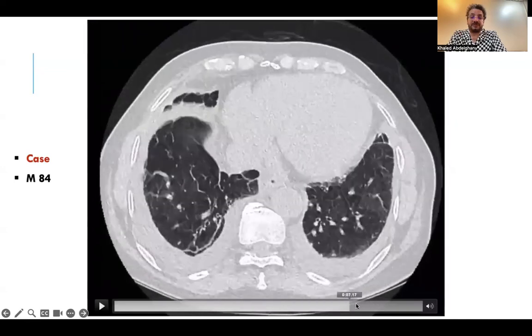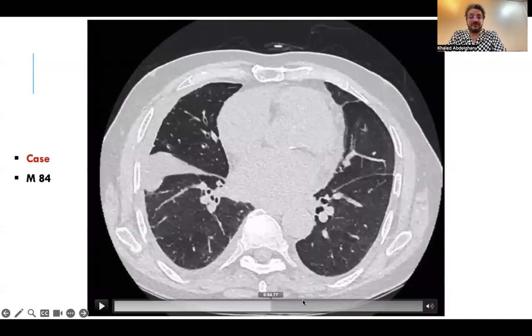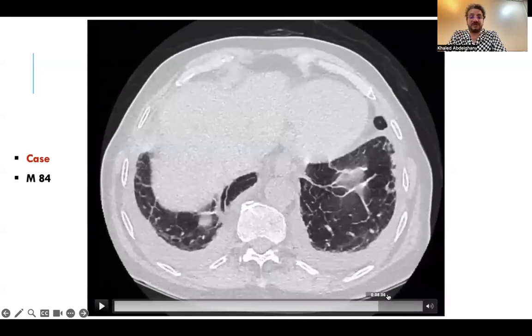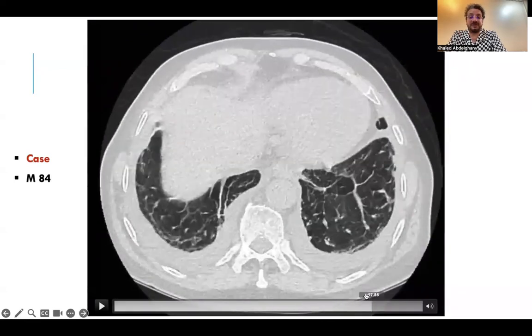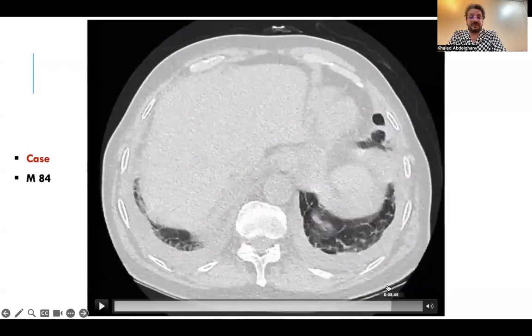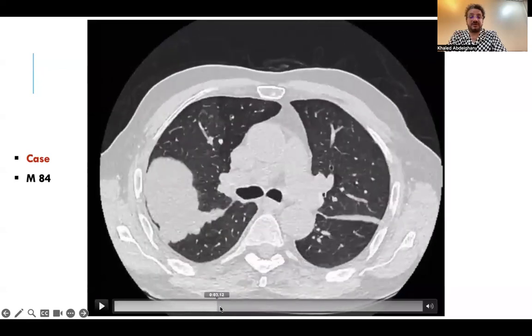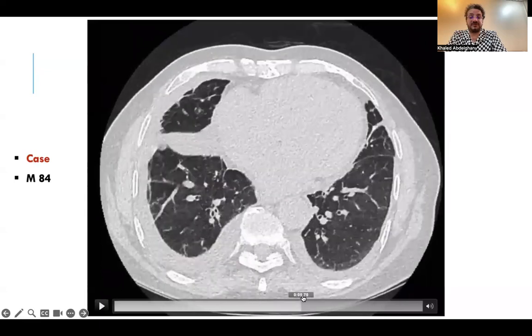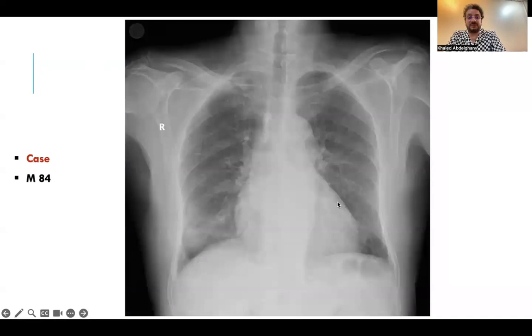Our role here is to shift the thinking of pulmonologists away from tumor or interstitial lung disease and mention that the case, frankly, is interstitial pulmonary edema due to the presence of interlobular septal thickening and transudate effusion, likely because there is extension into the fissures. This patient, when he is treated properly as congestive heart failure, the findings subside in the chest X-ray.